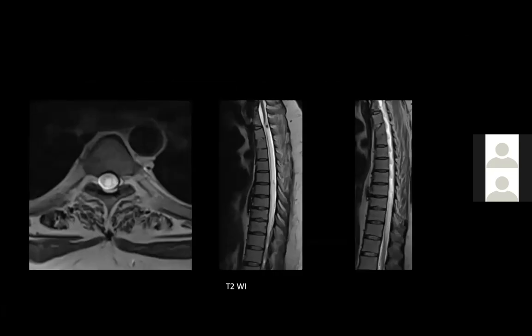On the spinal cord imaging, we see a long segment lesion involving the entire lower thoracic spinal cord. We see this lesion spanning the whole diameter of the spinal cord on the axial plane. And we see some post-surgical change in the upper thoracic spine due to previous surgery.